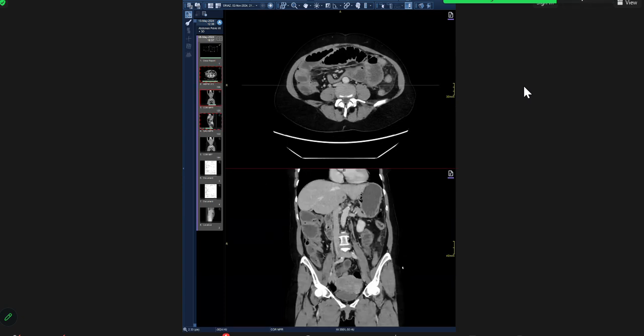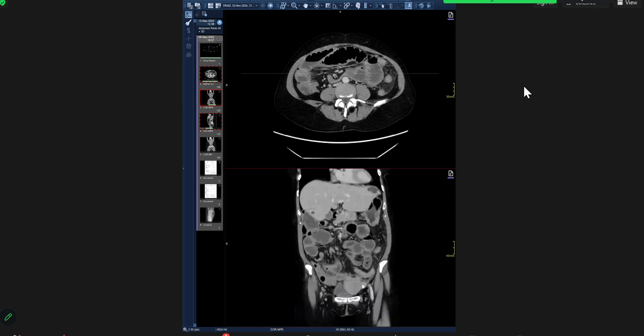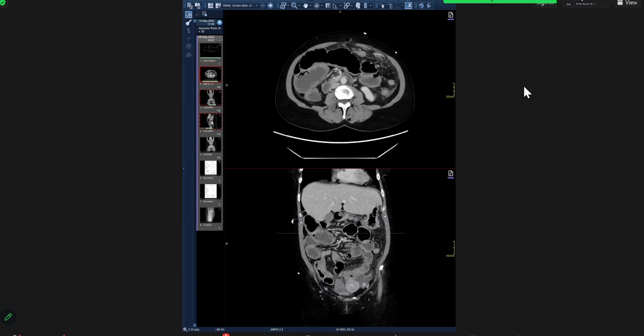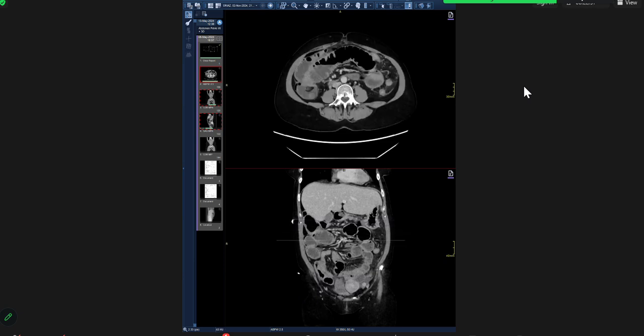The patient is, you see that the bowel is dilated. So what do you want to do? I will go for an ultrasound. Where will you refer the patient? To the gastroenterology team. Maybe the surgical team? Yeah, the surgical team. Yes, ma'am. The bowel is dilated, right? Yes, ma'am. The bowel is dilated.